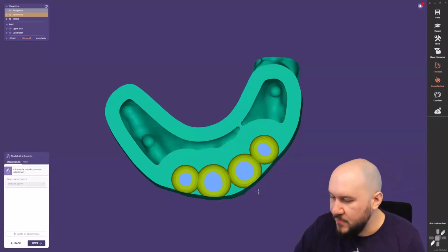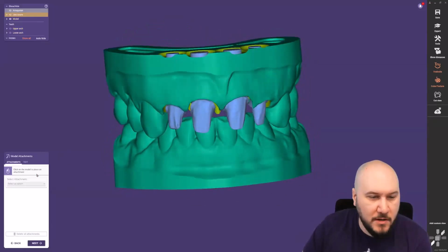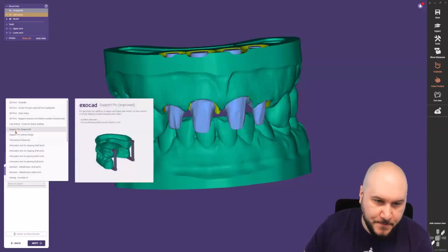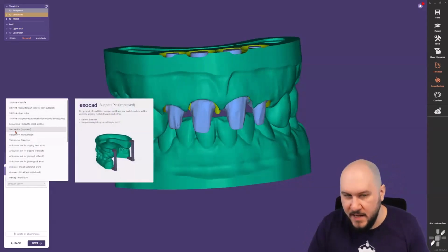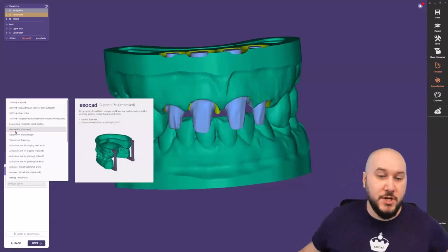We'll just go through it. Okay, now we have our stumps done. We have our model stump. We can also now see here our attachments, and our attachments now have pictures with a short description, also the scalable diameters and what you can do with that.